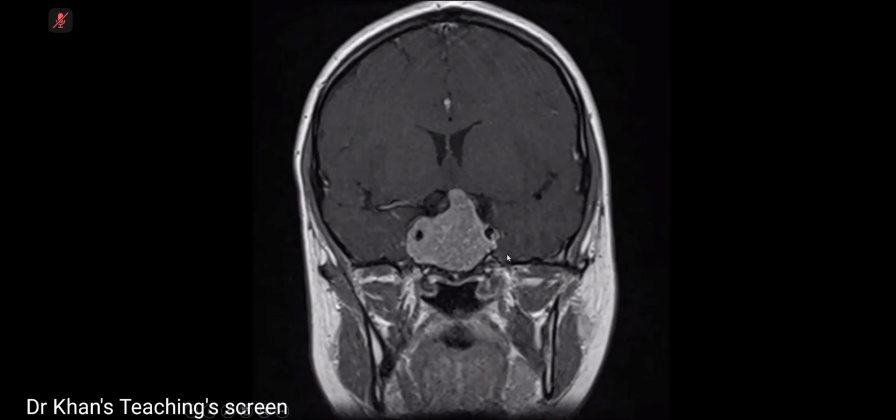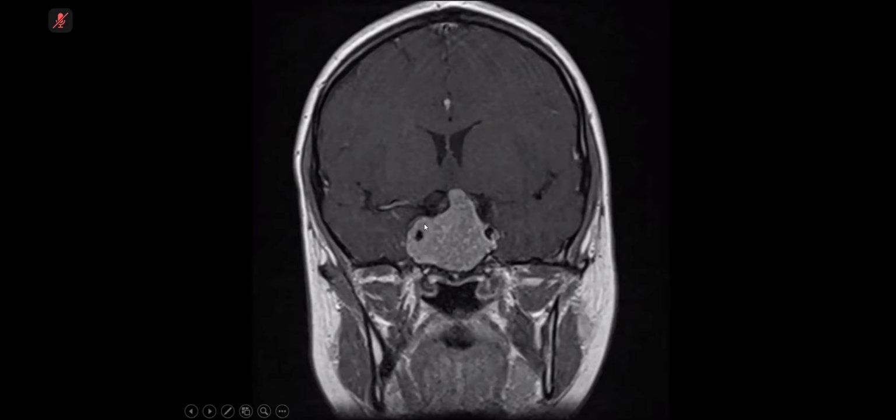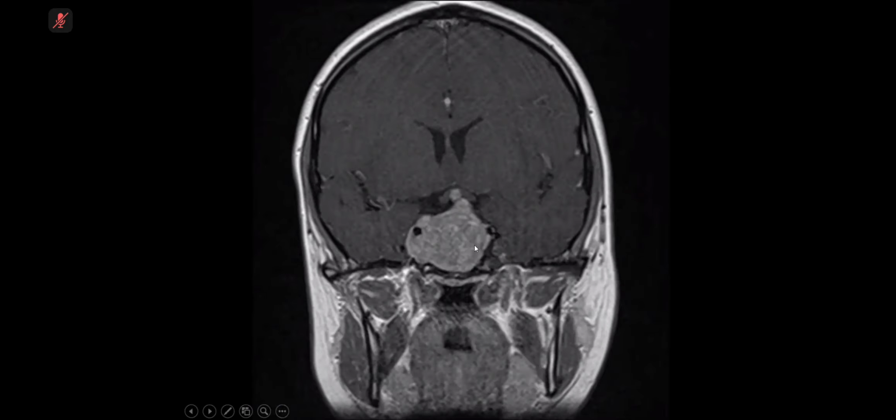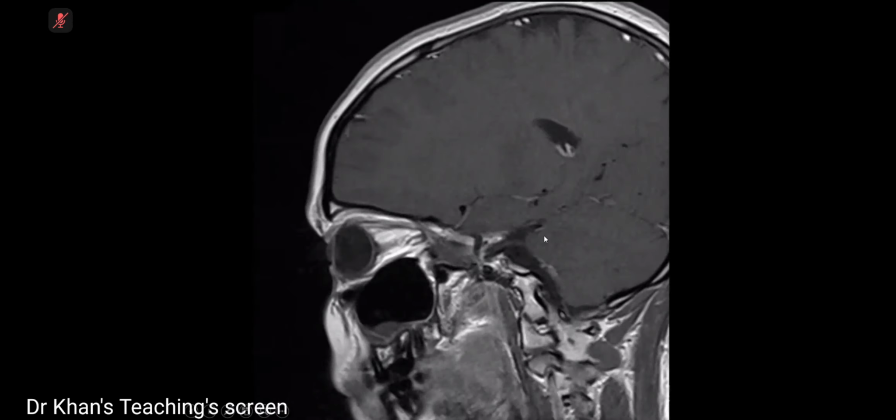And in this case, you can see how it is encasing the cavernous sinus, internal carotid artery. So there is radiological evidence of cavernous sinus invasion. Let's go to another case.